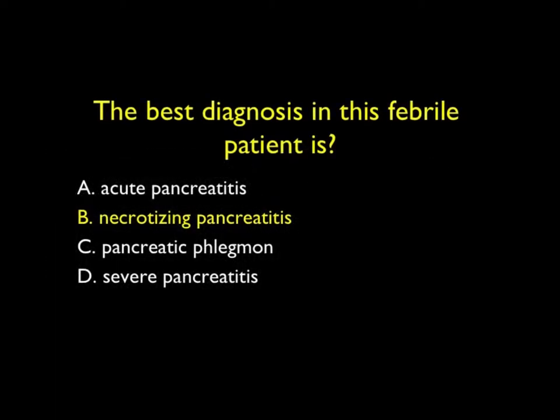In this case, you would have to worry this is indeed infected. You also can see there's some enhancement of the tail and head of the pancreas, but most of the body is not enhancing. This was a wonderful example of necrotizing pancreatitis.